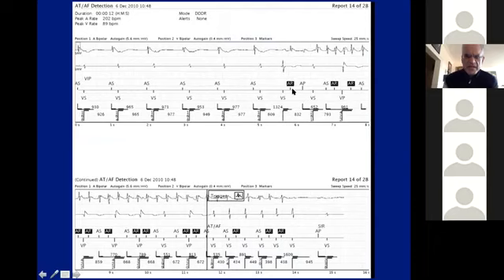What is happening here? Why is this, in black, AR, AP, atrial in refractory, and then an atrial paced event? What does it mean? Why is the device pacing the atrium when there was an intrinsic atrial event? Because the intrinsic atrial event was in the PVARP? Yes, it was in the PVARP. So why is it pacing? Because it's ignored for timing purposes, right? Yes.